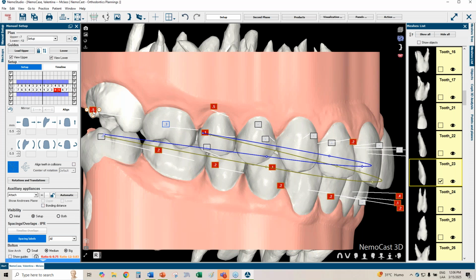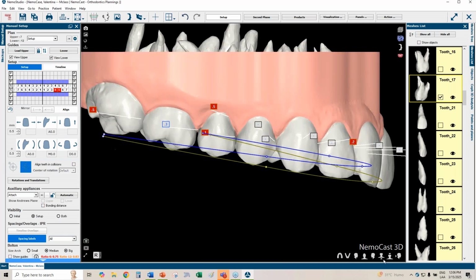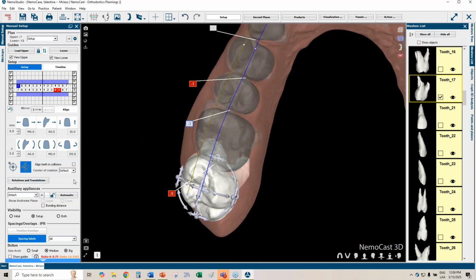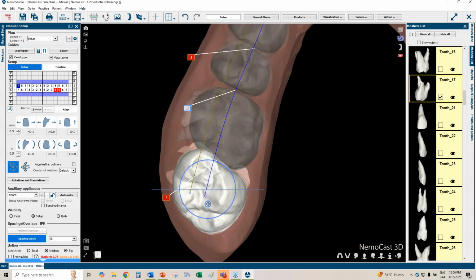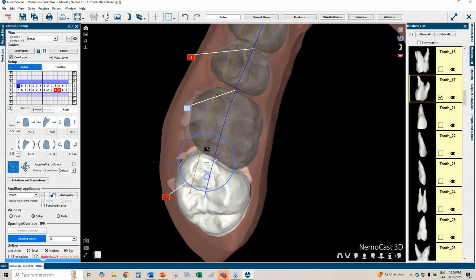We have a little bit of collision, but since we're at second molar, I can always perform some movements. For example, a good movement, since I'm expanding, I could take into consideration the expansion of this molar to constrict it a little bit and also distalize it enough so it doesn't create contact, right?